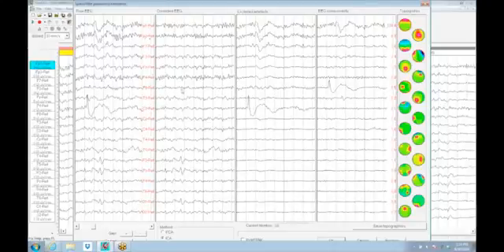This is being pulled out as that component. And it's unlike the T3 getting rid of that little wander, this is pulling it out as a discrete click. That's a hit that's being pulled out. Now it's pulling this out. It's not touching the little sharp stuff that happens to be in the EEG. It's only pulling out stuff that's focal to this C3, and that's a very, very isolated component.